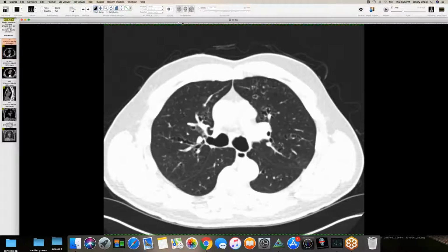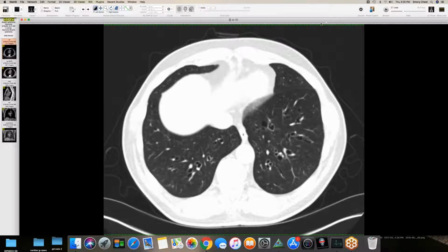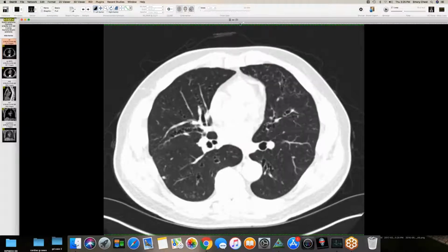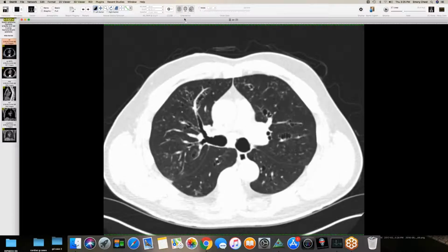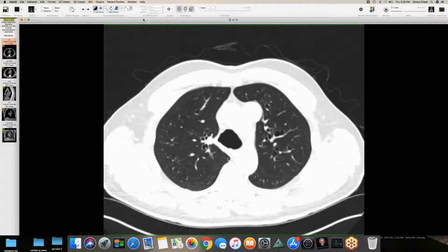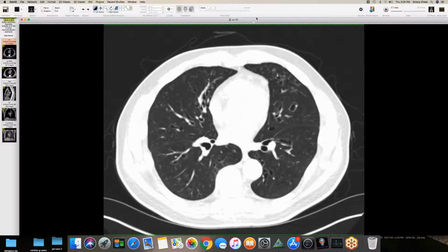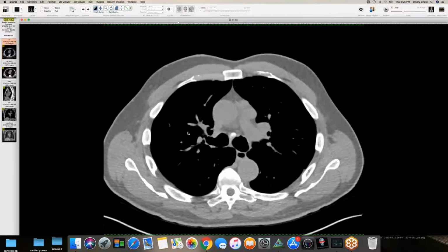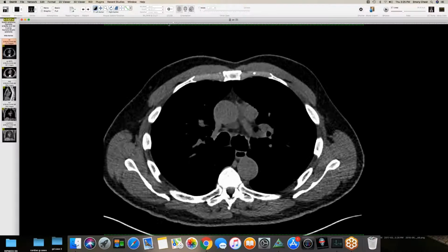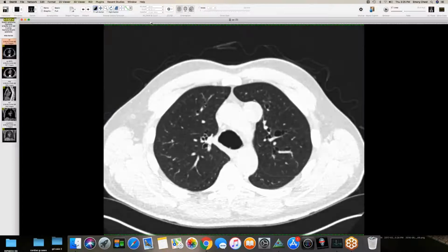But I would call this Good syndrome, with chronic infections presumably leading to secondary bronchomegaly, and this bronchial distortion in the setting of ongoing infections due to the immunoglobulin deficiencies in the setting of a thymoma. So I just thought this was a nice, interesting case of Good syndrome.